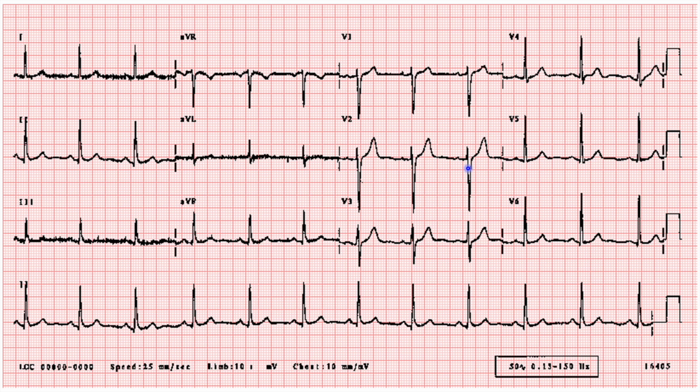And so here's the output that you're going to get with that. The way you look at this is it's going to tell you which lead you have here in the corner, and then it gives you the rhythm strip from that lead. So from here to here is lead 1. And so you have leads 1, 2, 3, aVR, aVL, aVF, and then V1 through V6.